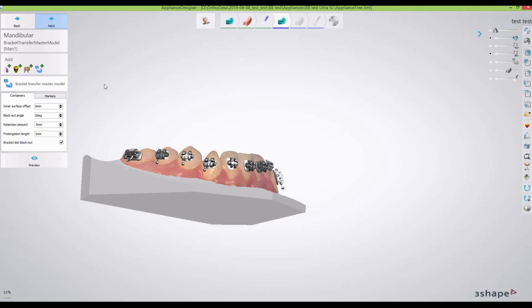And again, we just take a little bit of time to render. This is the time you can get up and go pull something off the printer and wash it and get that started, so it's not like you're just hanging out here waiting. I think some of the things that I really want to share with you, and I'll share in the next slide, is that you're getting the right files and that you've also set some of the default parameters in your control panel to be able to do this technique.